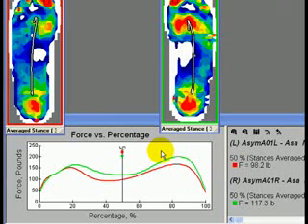that they're not similar. And also, if you look over to the right, these force numbers, at the same point in time, the force under the left foot is 98 pounds, and the force under the right foot is 117 pounds. So between the pressure profiles, the loading patterns, and these force numbers, they all point to the same thing, which is there is asymmetry and there's higher force under the right foot.